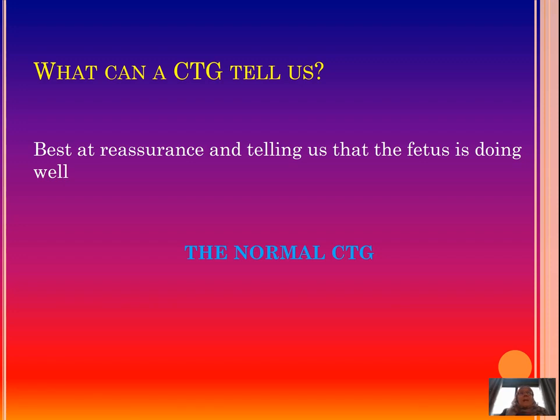But a normal CTG is very reassuring, and it tells us that the baby is doing well at this moment in time. And this is the real benefit of a normal CTG, and this is why it is also very necessary to recognize when a CTG is normal. Recognizing a normal CTG also means that you will recognize when a CTG is abnormal, and this is why we are going to focus on the normal CTG in this presentation.